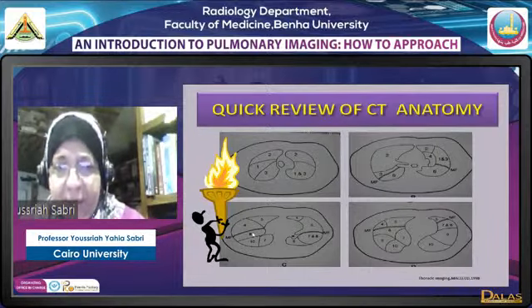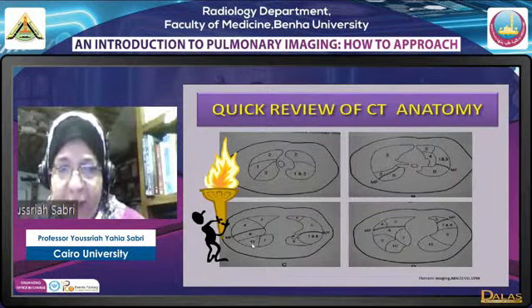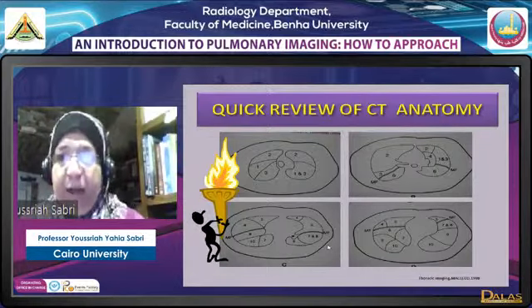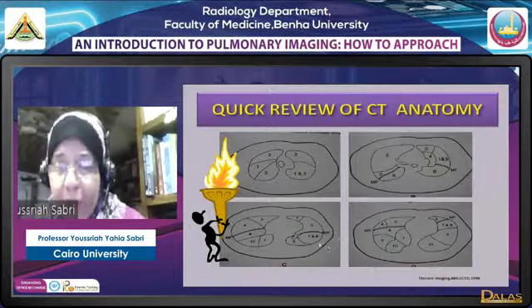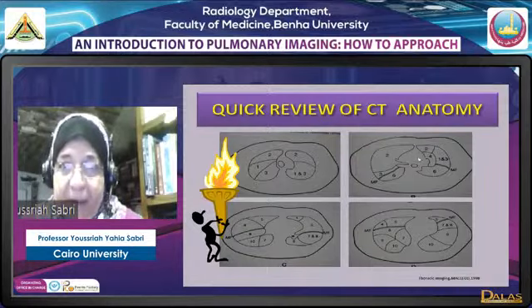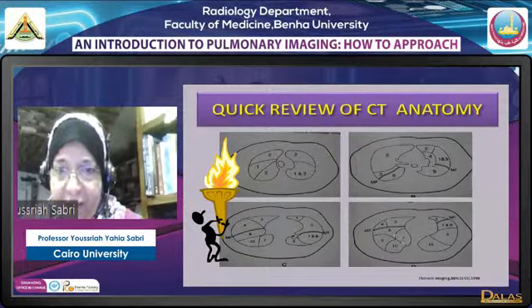know. anterior basal هتبقى قدام، والposterior basal هتبقى ورا، والmedial basal in the azygoesophageal recess. Here we have the anterior basal and the posterior basal. طب where is the lateral basal? We have said من ال PA film ان اللاترال بيزل موجوده في البلورال ريسيس، فهتبقى تحت شويه، هتبقى اول ما يبان البلورال ريسيسز هيبقى عندنا هنا anterior basal, posterior basal, medial, lateral basal اهي بتبتدي تبان تحت، وهنا عندنا anterior basal, posterior basal and lateral basal. يبقى اللاند ماركس بتاعتي هي الاير واي والكونفيجريشن بتاع الهارت.